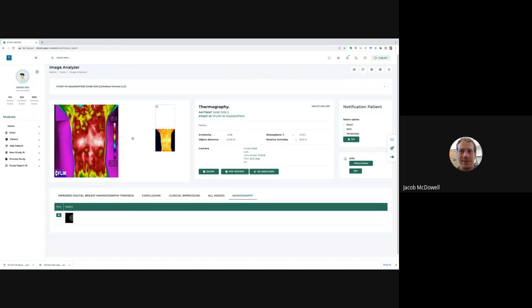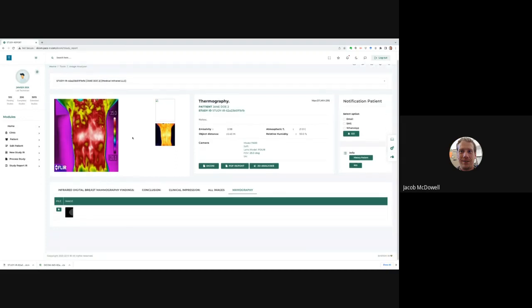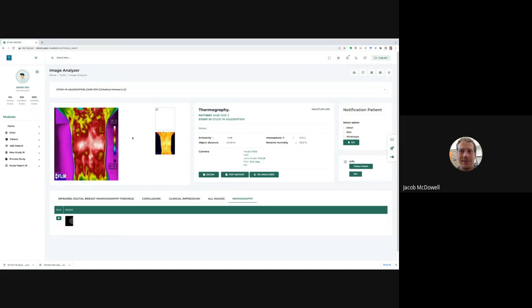And what else? So this is primarily an interpreter who would be doing all this, right? That's correct. Yes. I mean, you don't have to interpret the image. You can save it as DICOM, and somebody else can read it and interpret the image later. For example, a technician can grab the images and save them, and he doesn't have to interpret the whole thing. He can save the DICOM file and send it to somebody else for interpretation.